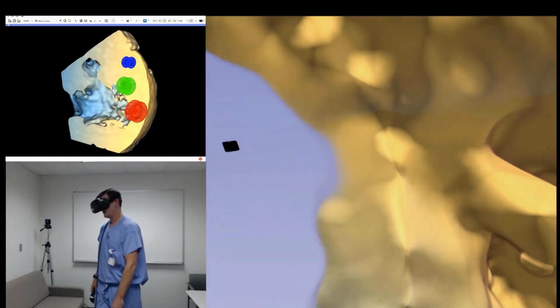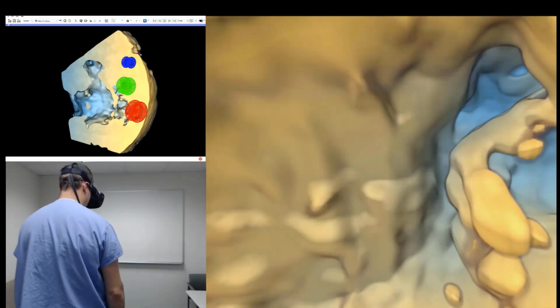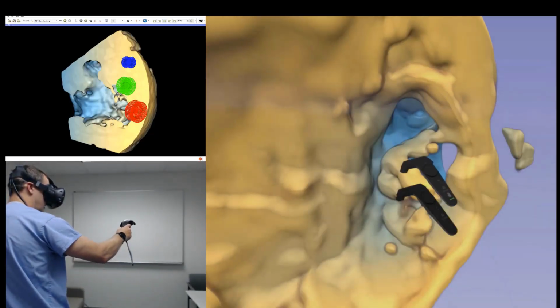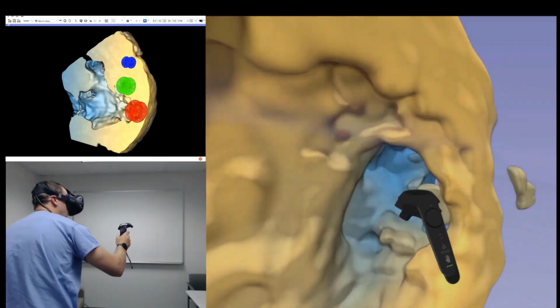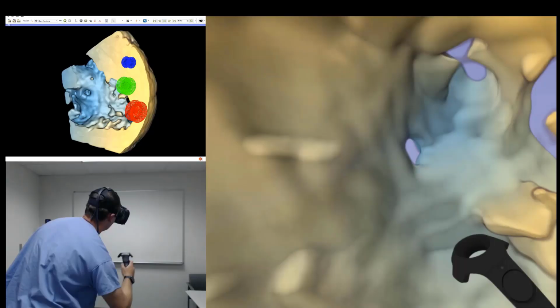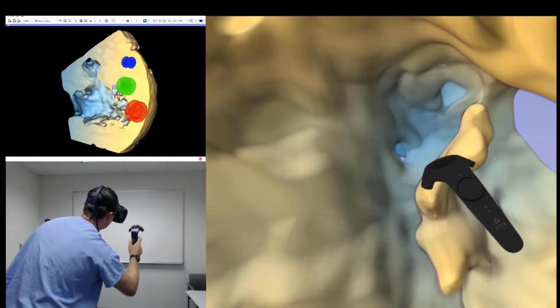We then walk into the left ventricle and identify the anterior leaflet of the mitral valve, the LVOT, and the ventricular septal defect.